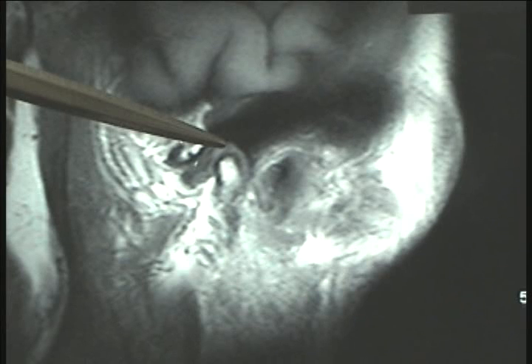The MRIs reveal that the discs within each joint were anteriorly dislocated without reduction. That means they were displaced to the front and did not go back into place upon opening of the mouth. This is why it hurt her to open and why her interincisal opening was limited.